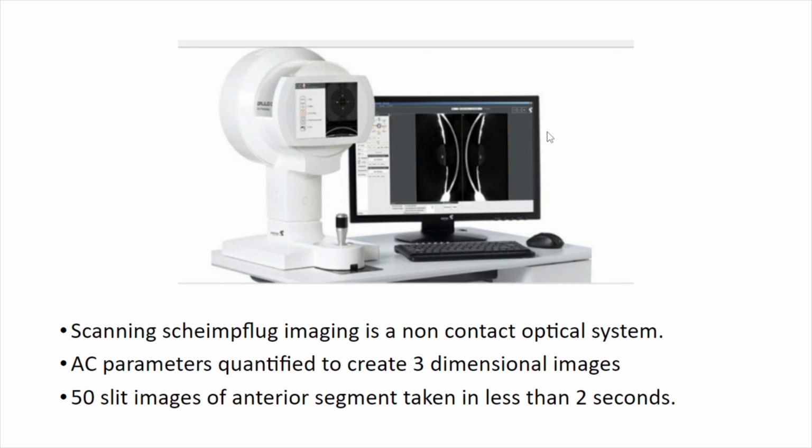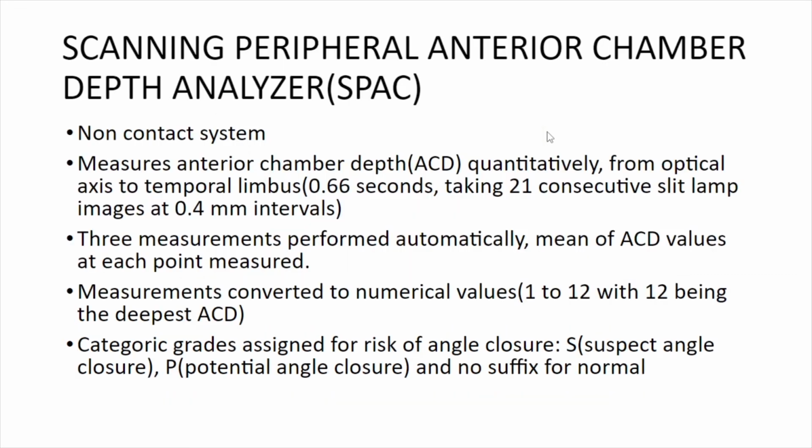It is a non-contact optical system, and all the AC parameters will be quantified to create three-dimensional images. We can get 50 slit images of the anterior segment taken in less than 2 seconds.